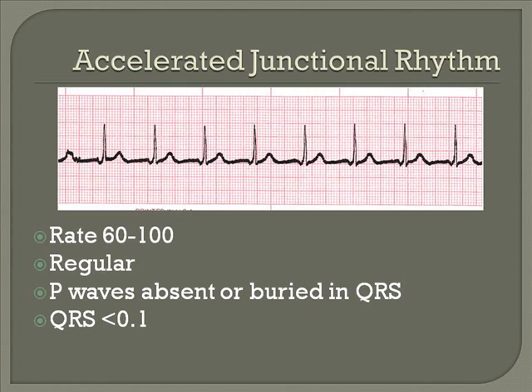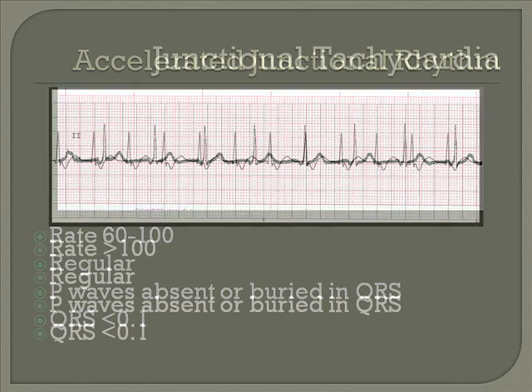Now, this person may be fine with this rhythm if they're maintaining circulation. Again, there needs to be some kind of investigation by the physician as to why the AV node is taking over and the SA node is not functioning properly.